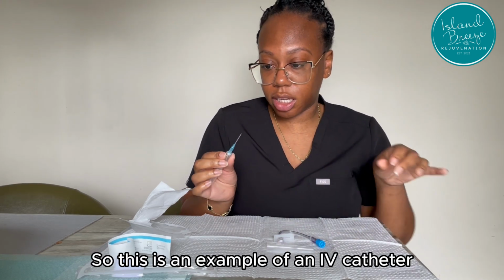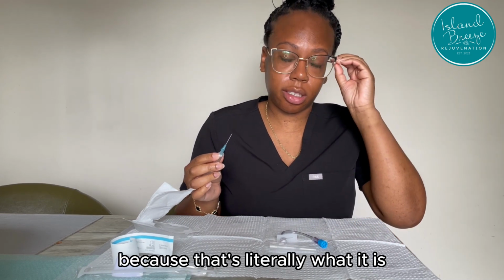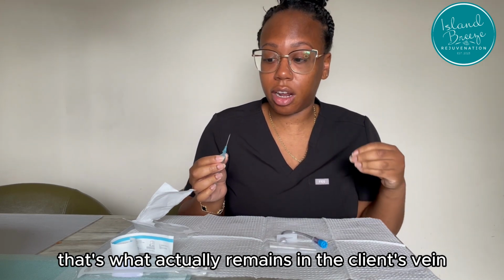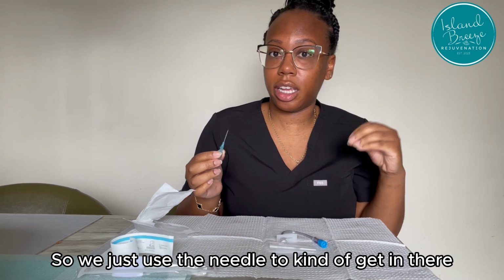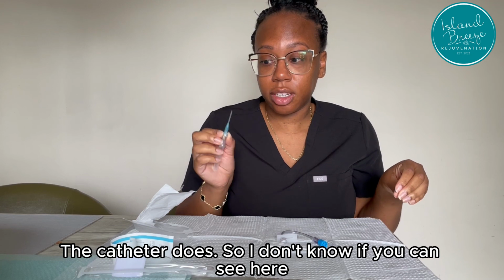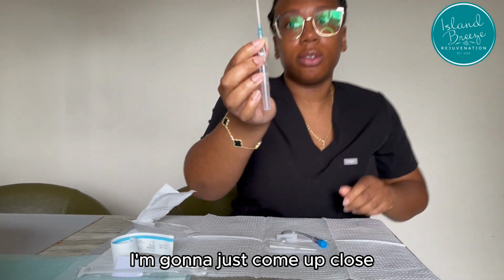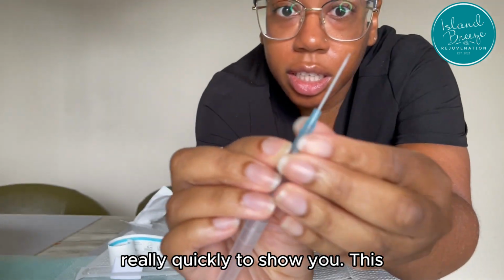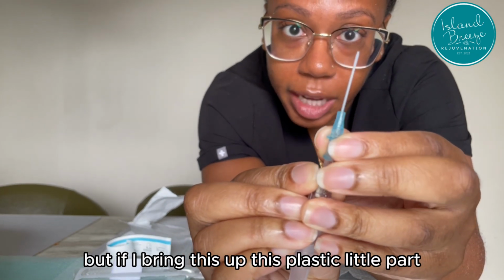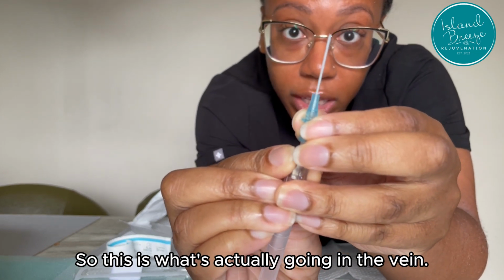So this is an example of an IV catheter, and I keep saying catheter because that's literally what it is. That's what actually remains in the client's vein, not the needle. So we just use the needle to kind of get in there, but the needle doesn't stay in the vein. The catheter does. So I don't know if you can see here, I'm gonna just come up close really quickly to show you. At the end, you can see the tip of the needle, but if I bring this up, this plastic little part, that's the catheter. So this is what's actually going in the vein.